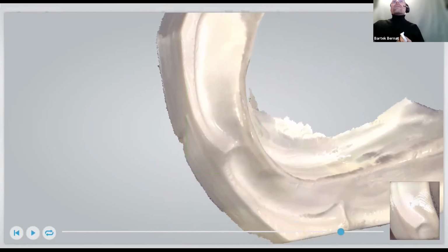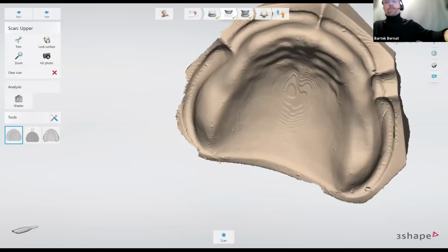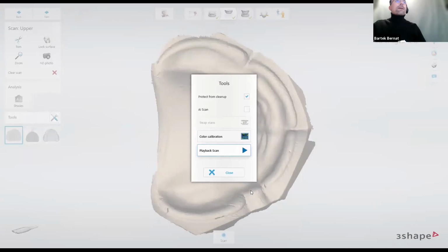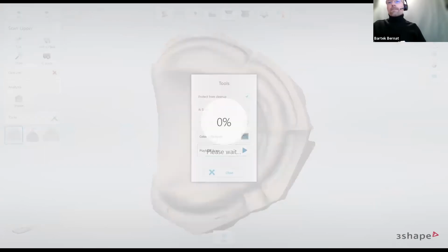Okay. Yep. So let's just now go to the upper one. Okay, and I'm going to start the playback again for that. Good.